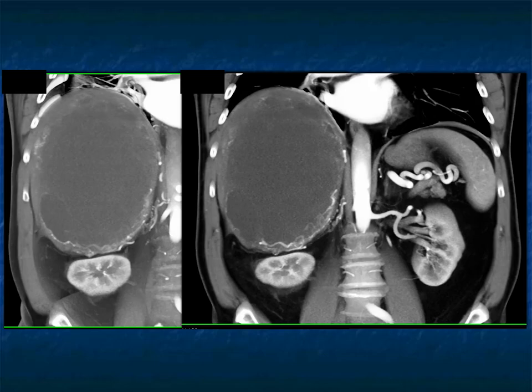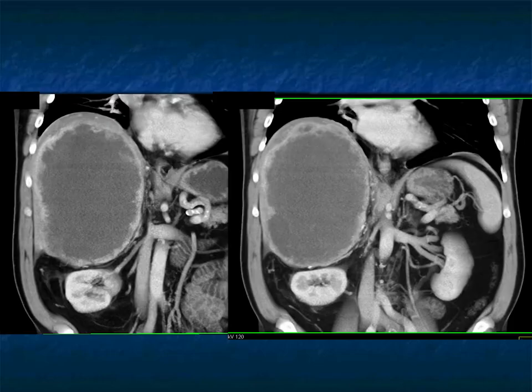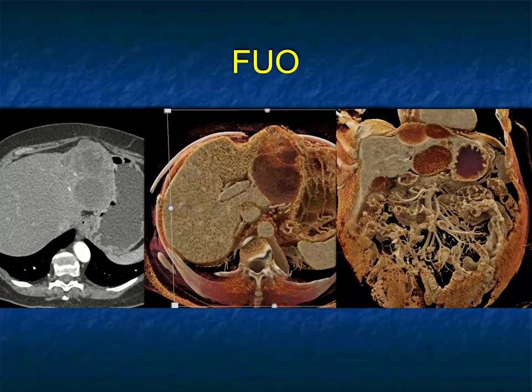I mentioned that the typical mets that go to the liver that are cystic are classically ovarian cancer, as well as GIST tumors, whether they're from stomach, small bowel, or colon. Also, melanoma can be very cystic. I love this case because look at the neovascularity. One thing from a technical perspective I find helpful is looking at lesions with MIP imaging. MIP imaging is very nice to show the neovascularity and the abnormal vascularity, and in this case, on later phase imaging, the really irregular and thickened rim of this complex cystic hepatic tumor.